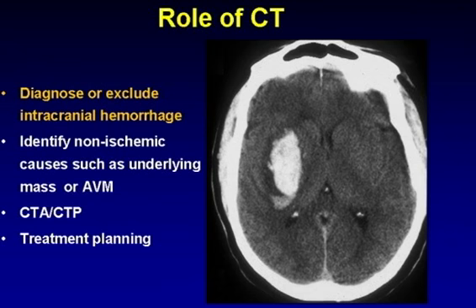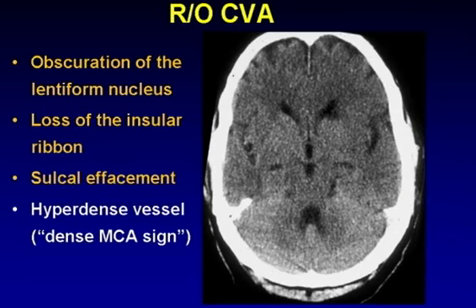And then we'll always at this institution do CTA and CTP, and I'll go over the protocol for that later on. So just to review the findings of acute ischemia.